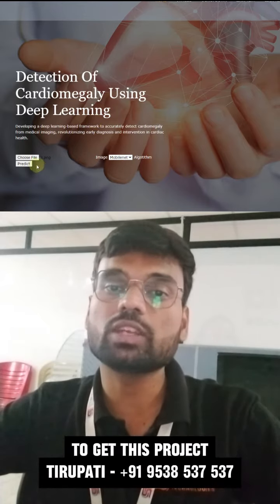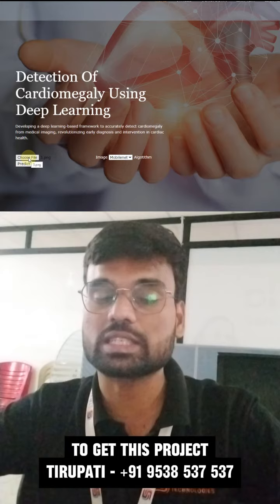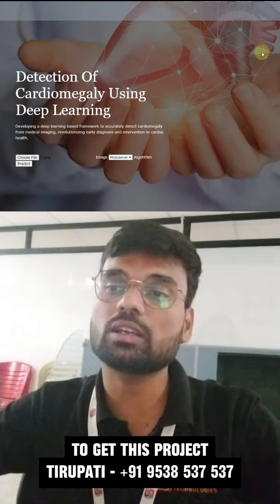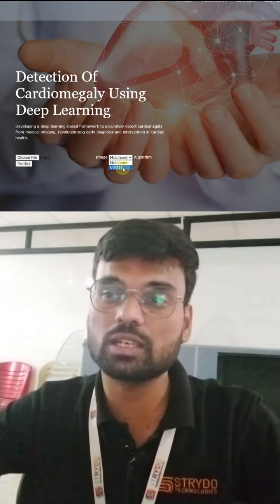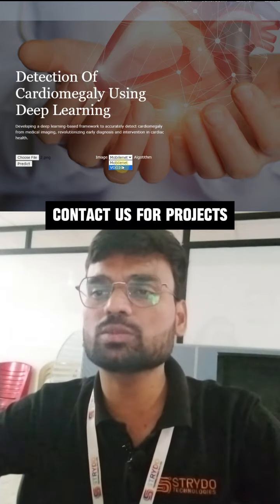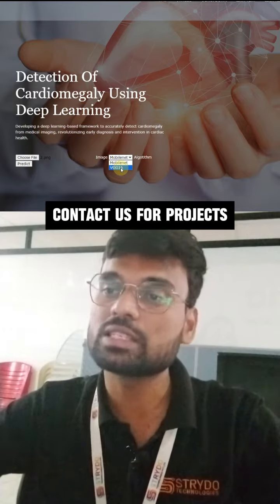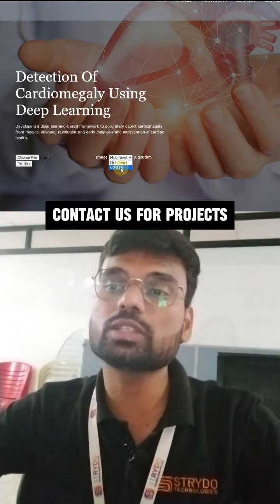So for this one we have to upload the cardiac X-ray image first. So here I am uploading the X-ray image. After uploading the X-ray image, I have to select the algorithm. Here I have given two algorithm options, VGG16 and MobileNet. In VGG16 I got 73% accuracy, and in MobileNet I got 72% accuracy. So I go with the VGG16 algorithm. After selecting the algorithm, I will click on this predict button.